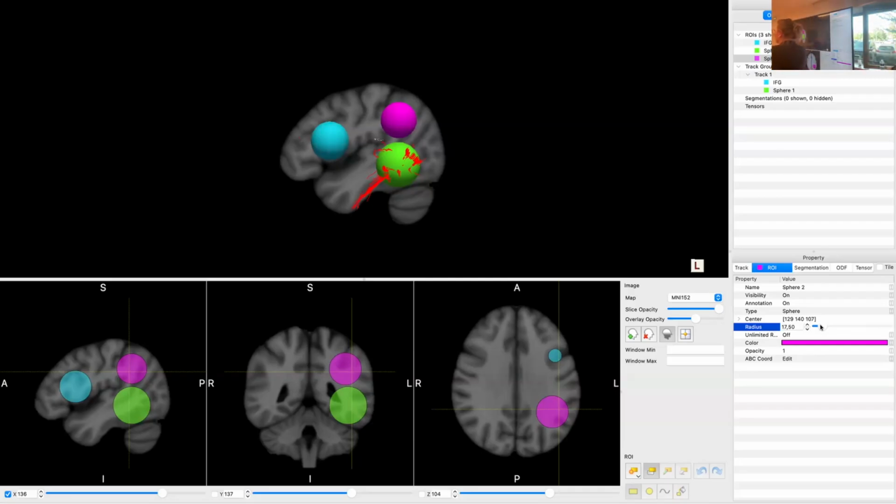So when we are drawing, why are we drawing so inside? So if the tract finishes here and here, why aren't we drawing on the surface only? You mean why we extend so deep into the brain? That's because the white matter runs deep underneath the cortex. And you've seen the maps earlier with the FA map where you lose signal as you go to the cortex. So if you just cover the surface of the brain, you're not going to get the white matter. So you have to extend your region into the deeper layers of it.